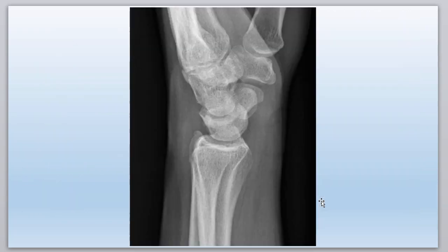This one is always tough. Okay, now this is a lateral wrist. This is probably one of the toughest views that we have. That's why I saved it for last. So to make sure it's a good lateral, you've got to make sure that the smaller ulna is superimposed over the fatter radius. The radius gets pretty thick down here, just the opposite at the other end, right? But down here the ulna gets slim, radius gets fat, and so we have good superimposition here.